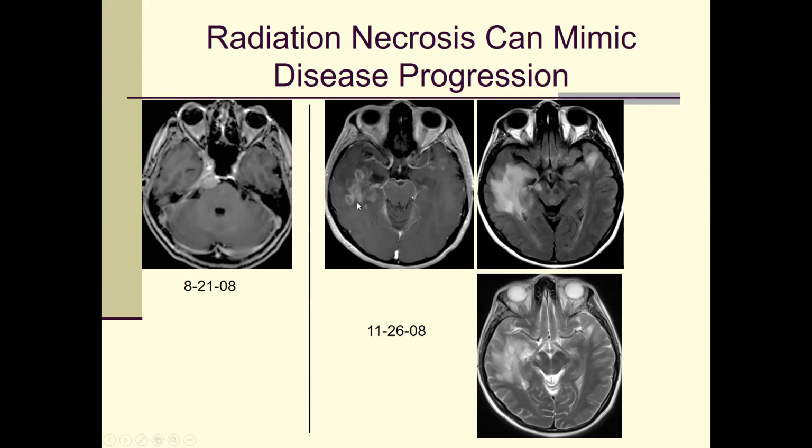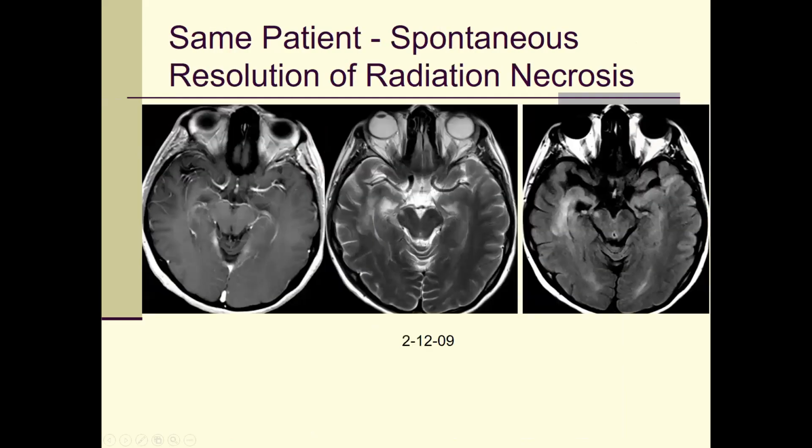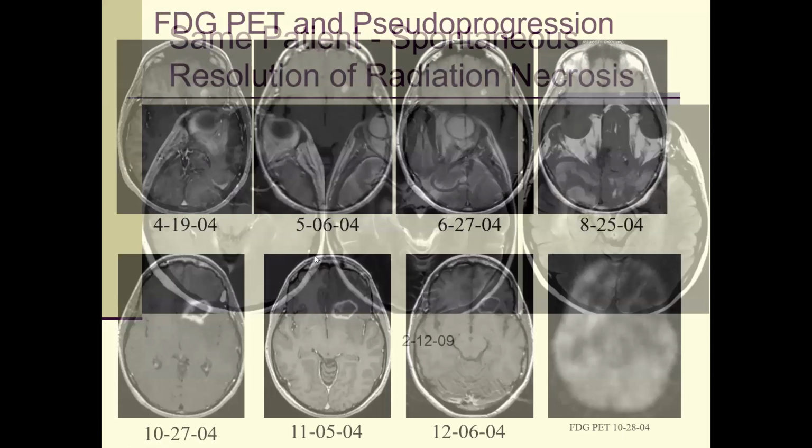Nothing to do with the brain. Brain tissue is not growing anything. It's just that because of the radiation, some necrotic tissue is happening. So radiation necrosis can give you this ugly edema and enhancement, which mimics the tumor. It is a very important thing to remember. And then if you follow these changes, they can subside, and you can see less edema and less enhancement.